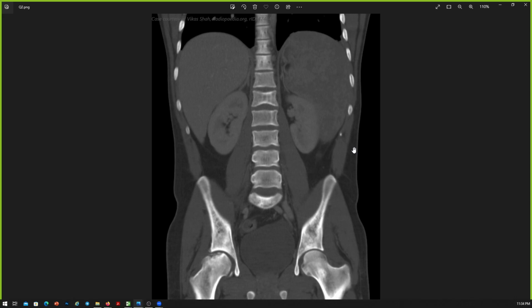Patient came to us with acute abdominal pain. Okay, this is a CT scan, coronal view, for a skeletally mature patient. First, I can appreciate diffusely sclerotic bone involving the visualized bones, the spine, the iliac and both femur bones, with some heterogeneity at the left iliac bone. Otherwise, I can see the L1 vertebral body showing biconcave end plates, suggesting an H-shaped vertebra. The right femur head showing sclerosis and fragmentation.